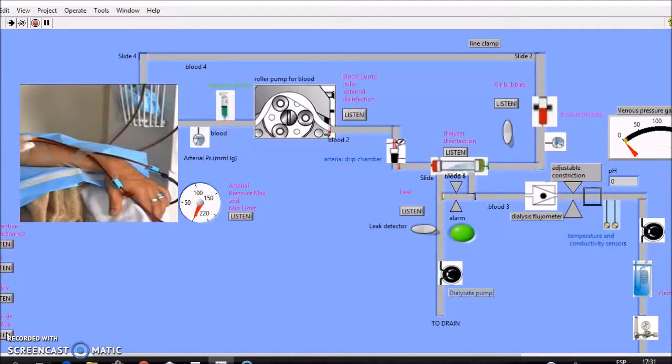Technical maintenance. This must be done by a biomedical technician. Change springs of the bicarbonate and acid pumps. Change of coils of the degassing pumps. Ultrafiltration pumps, spring change.